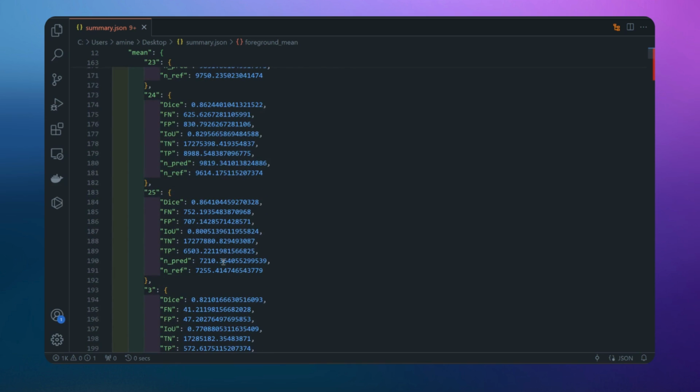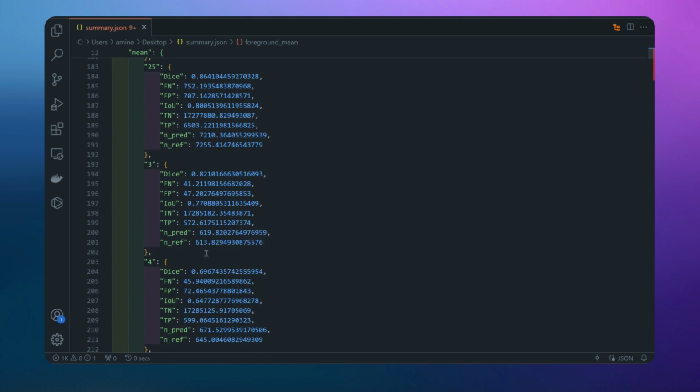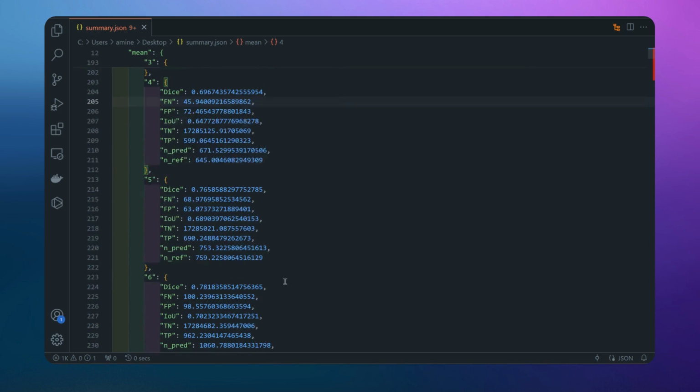Maybe you can increase the dataset. Maybe you can verify if that class is segmented well or not. So it depends on the specific dataset. But as you can see, there is no big difference. Only sometimes, as you can see here, it is about 67% compared to the others, most of which are above 80. But of course, if you see something like this, you may go and check this specific class. Maybe there are some issues with the annotation or something. This is something you need to consider if you want to increase the accuracy of your model.